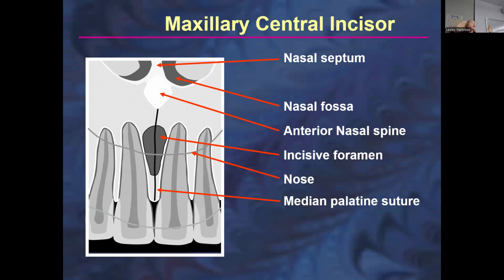Critically think, is this arrow encapsulating it? Are there three arrows and they're kind of in a circle, or are there arrows that are up against a line? I've stared at this exam so much, and it's really obvious to me, but I think it needs to be said: let the arrows help define what it's looking at. It is really laid out for you visually. You'll see that in some of the examples of what you're studying.